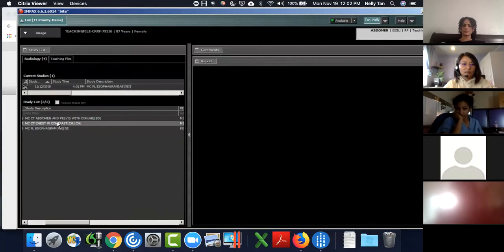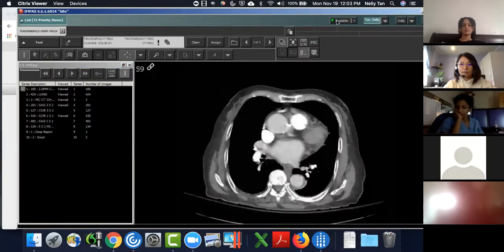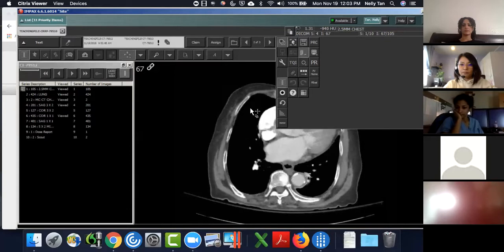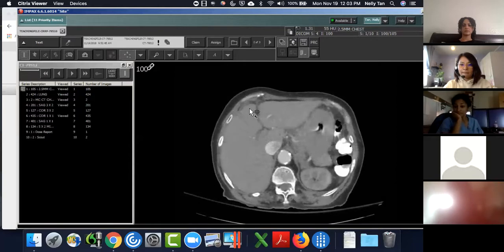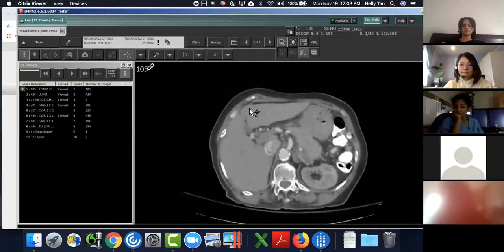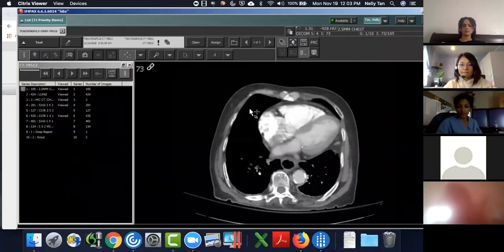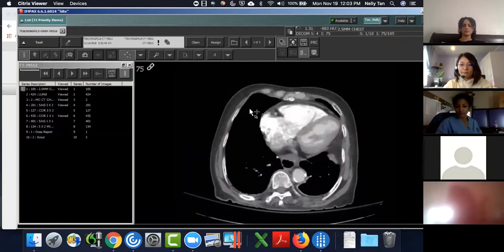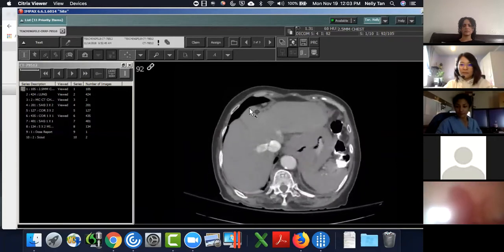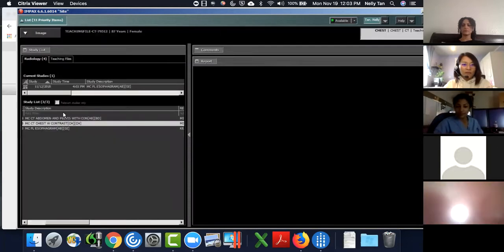abdomen, pelvis. So here's the CT chest. So here, there it is. There it is. Oh my God. What do you guys think? Tumor? Maybe. Yeah, it looks like linitis plastica almost. It may give you the abdomen pelvis just a sec.